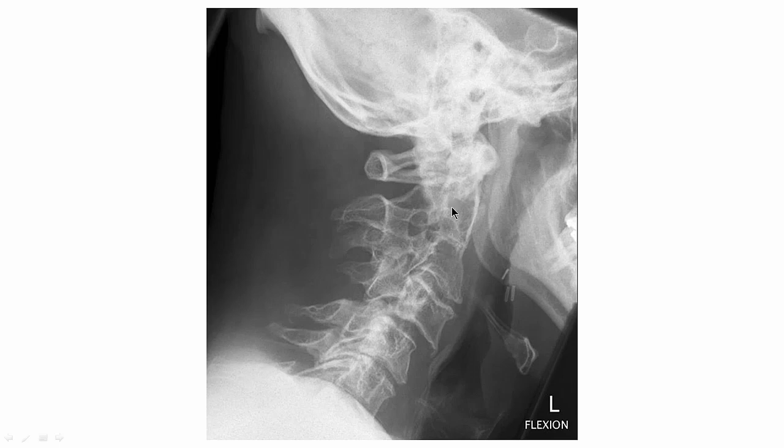Is there something else weird here? But let's check the other one. So here's the spinal laminar line. Okay, so it looks nice, smooth here. And then, whoa, where'd it go? I can finish the line here. See, I could draw it like this. I could finish that. But where is it here? It's way up here. So that's another way if you didn't catch it. Posterior longitudinal ligament's a little bit harder to catch, but hopefully that jumps right out at you. This patient needs to be referred out of your office immediately to the emergency room. Right? You can't adjust them. You could kill them.